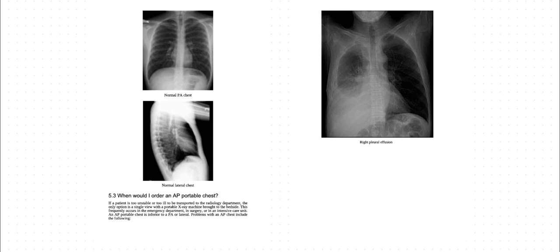Look at the bottom of that right lung. That huge white area, that's a pleural effusion. It's fluid that's collected in the space around the lung, and it's completely blotting out that sharp corner of the diaphragm you can see so clearly on the normal X-ray.